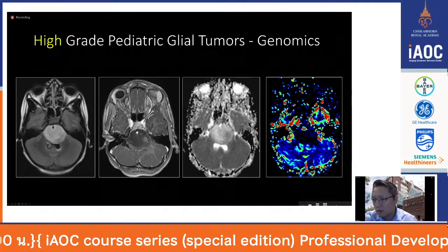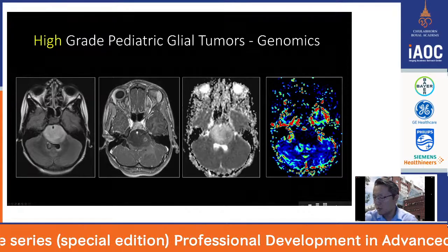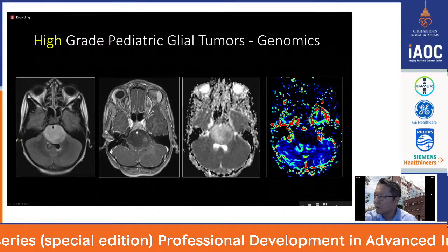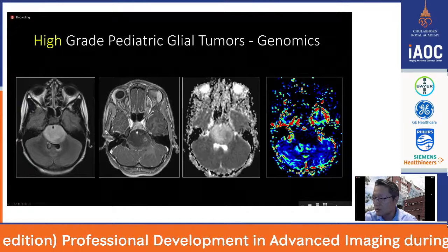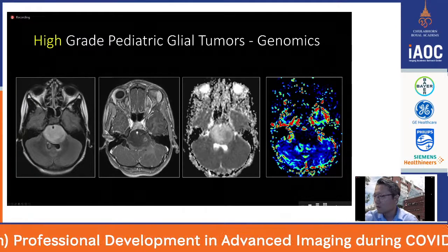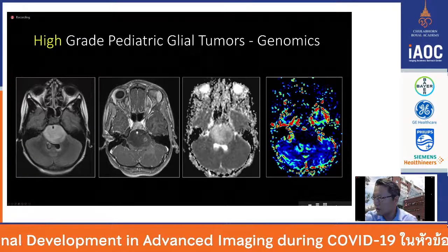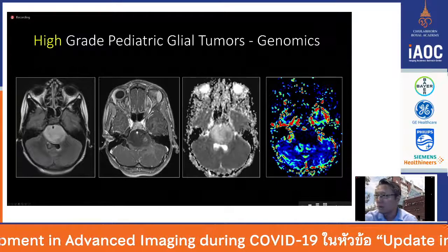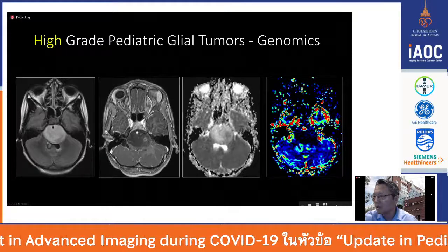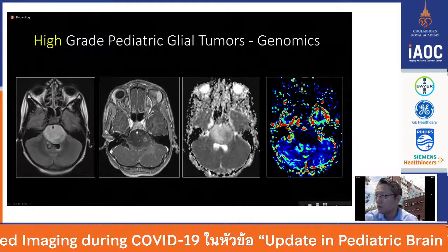This one also has a little bit of ring enhancement in just a small portion of it, which shows a little bit of decreased ADC, but the rest of the tumor has increased diffusion. So if you average this out, certainly it would seem like increased diffusion, where you would see a low-grade tumor and not increased perfusion, but we do see a little bit of perfusion, again, in that ring. And so, again, this also was a DIPG. So even if you're radiographically suggesting that it could look low-grade, we all know that this is going to be a poor outcome tumor.